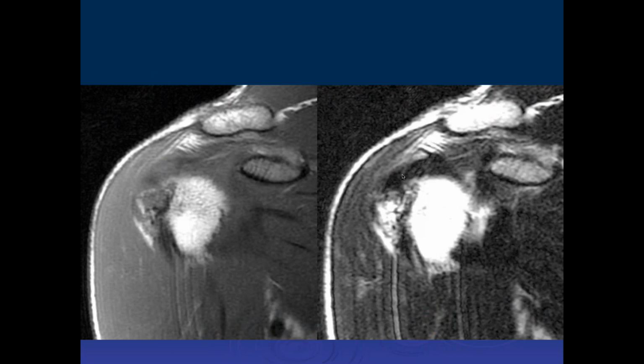Okay, Thomas, what do you think of this one? So two coronal views, and that's the biceps. In case you couldn't tell, this is one slice plane. You could follow the biceps up through here, and when you follow it on the other images, this is the biceps tendon itself right here. So yeah, I'm not sure if it's continuous.